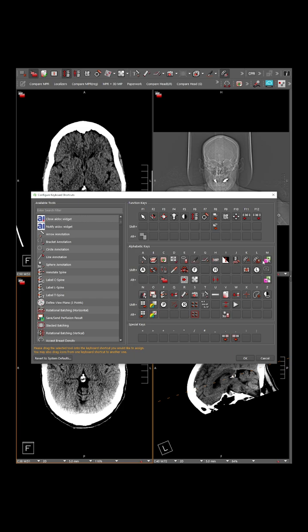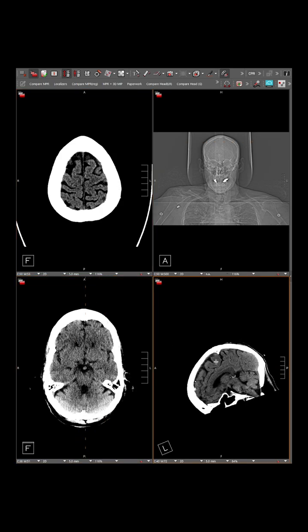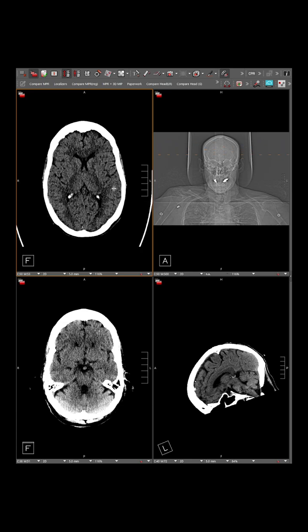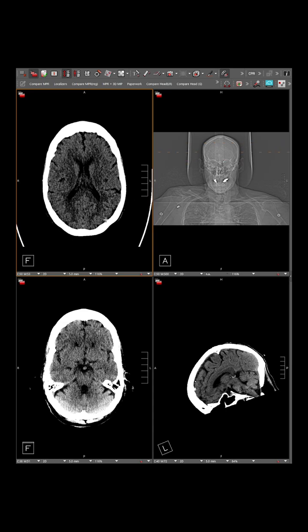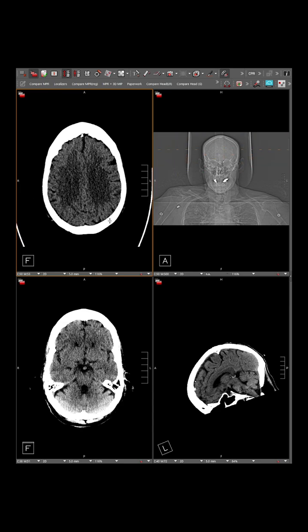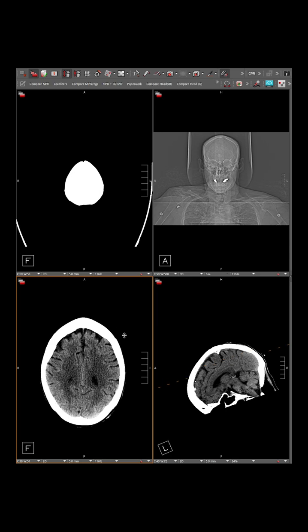I think we've basically covered the most important things that you can do in this kind of view. We can cover some other tools that are more helpful for an MPR in a separate view. Some other niche things: there is an auto scroll built into Visage, so I have it set, I think, as Shift W, and it'll auto scroll a set of images. It doesn't scroll backwards, so it only goes forward, and it'll repeat from the beginning, but that's not bad.